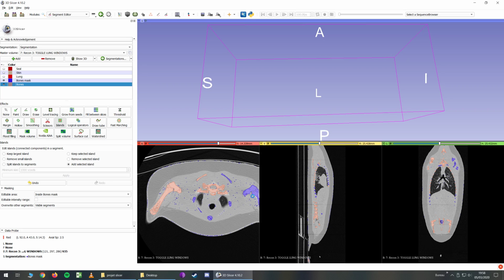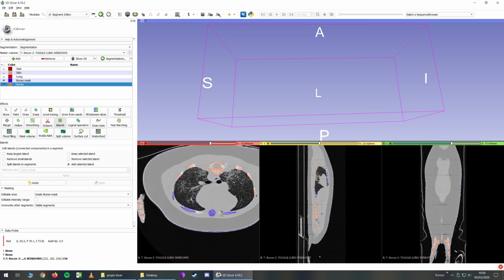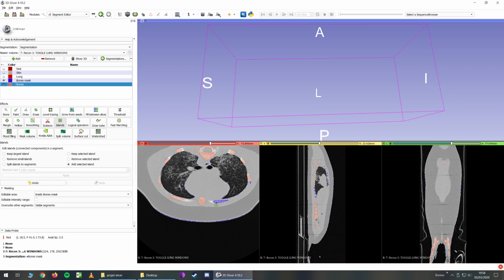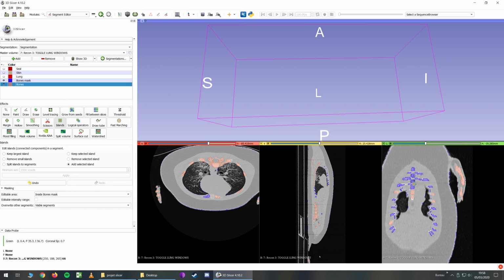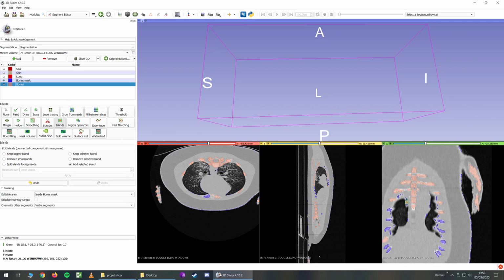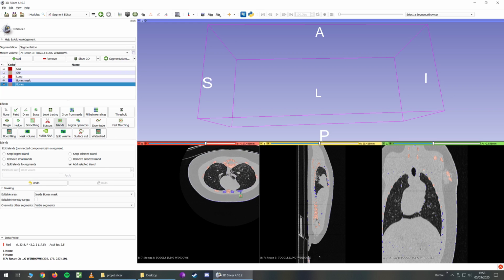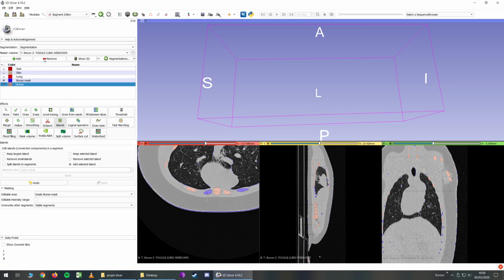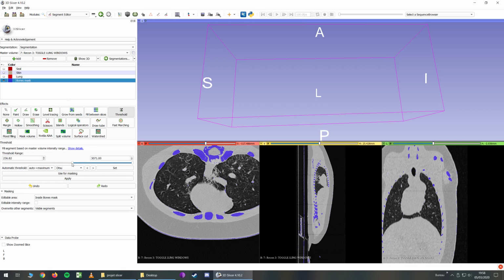Okay. And you add the segments you want. Maybe I should have set a different density. It's a little long here. No, it's too long. I'll do it again. It's not acceptable. Let's create bone mask again and set it like this. Okay, it will be better.